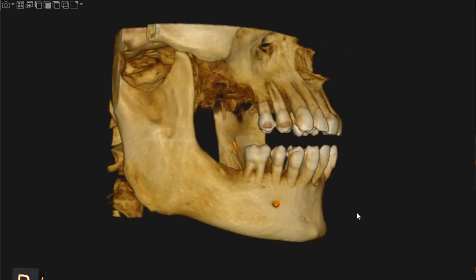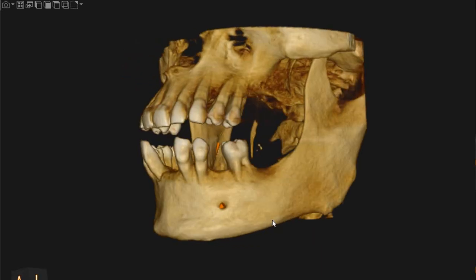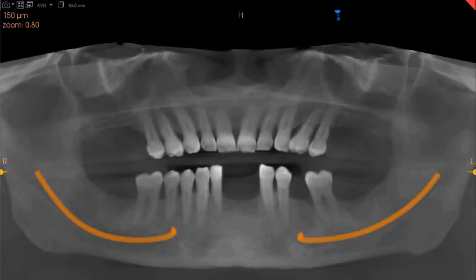This is the CBCT of the patient that you had requested. The area of interest is implants in all the edentulous spaces. On the panoramic view, you can see that we have periodontal disease and we have a few recent extractions with bony defects in the edentulous spaces.